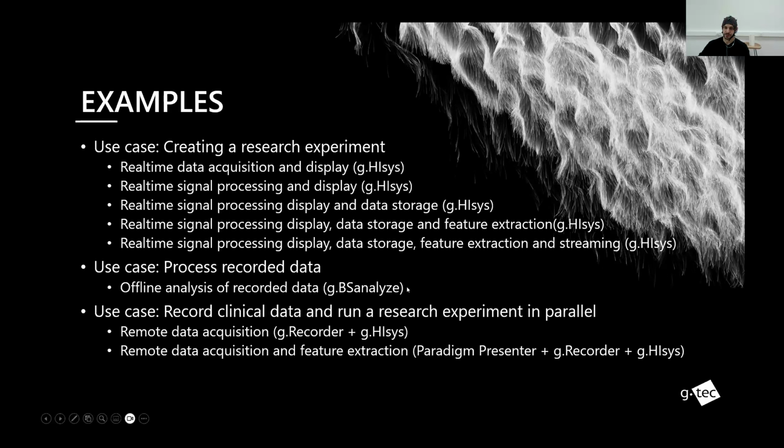I also want to show you g.BSanalyze. In the g.HIsys model, we are going to add some data storage, and I'd like to show you how to load this data in g.BSanalyze afterwards. And finally, I want to show you g.recorder, which is another standalone application, and how you can stream data from g.recorder into g.HIsys.